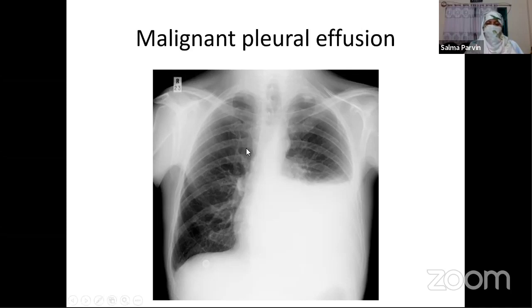It means that there is an active collapse of the left lung previously present here, and the effusion here is producing a passive collapse. The active collapse, which would cause a local volumetric reduction, is compensated by the positive pressure of the pleural fluid.